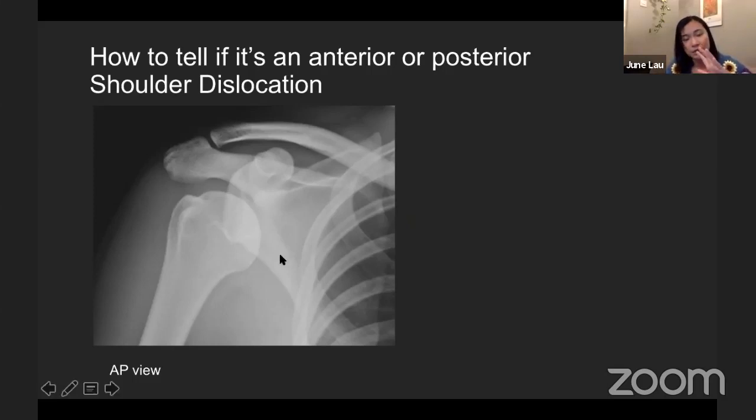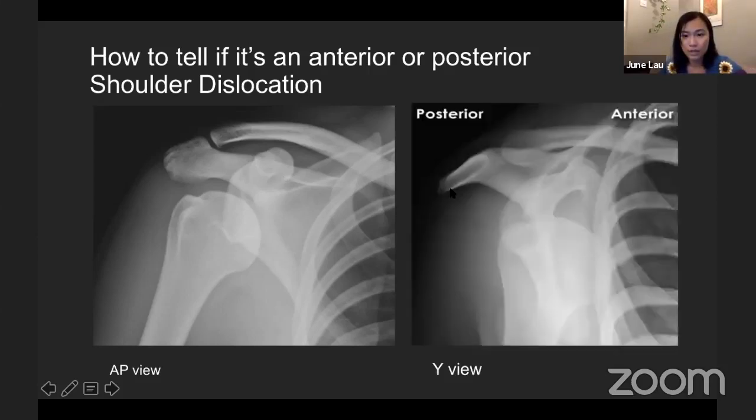So basically, if you think about your shoulder, an anterior dislocation has to come forward, but because you've got this coracoid in the way, it has to come underneath it. So if your shoulder's humeral head is dislocated and inferior to your coracoid, then it has to mean that it's come anteriorly. And I can prove this by looking at the Y view or an axial view. Mostly a Y view, and you can see that your humeral head is displaced anteriorly under the coracoid and away from the acromion.